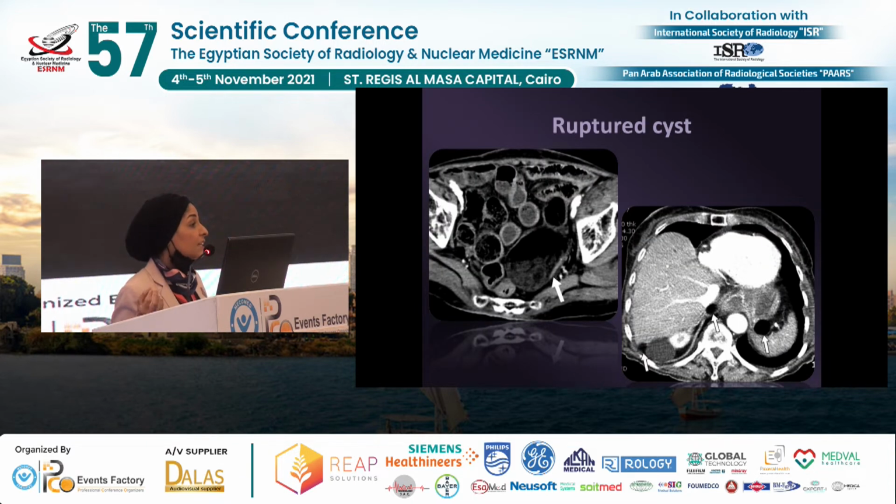And then we have the setting of the dermoid cyst. The dermoid cyst per se is not an emergency, but its complications are. One of the complications would be a rupture of this cyst, whether due to trauma or iatrogenic, whatever the reason. And on ultrasound, you don't find that much vague details. It's non-specific, so you do a CT, and you can clearly pick up fat lobules lodged within the recesses.